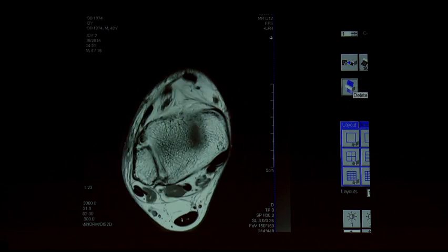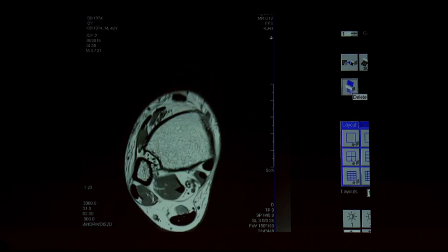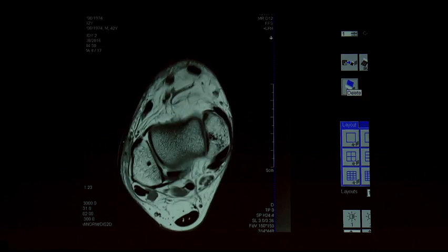And when I am going down, and if I am seeing the tibial plafond, what I am seeing is the anterior tibiofibular. You can see the anterior tibiofibular and the posterior tibiofibular. So these 3 high ankle ligaments I have shown you. One is the syndesmotic ligament. What you are seeing is the flimsy low signal structure. When I am going down, I am seeing the tibial plafond. You can see the classical anterior tibiofibular, posterior tibiofibular. So how to look at high ankle ligaments?